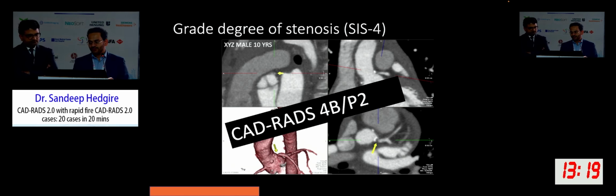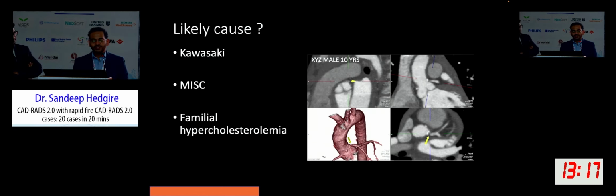But hang on a second, I said please note the age of the patient. So please raise your hand if you think this is secondary to Kawasaki disease.